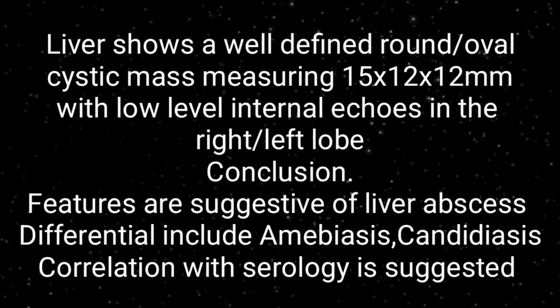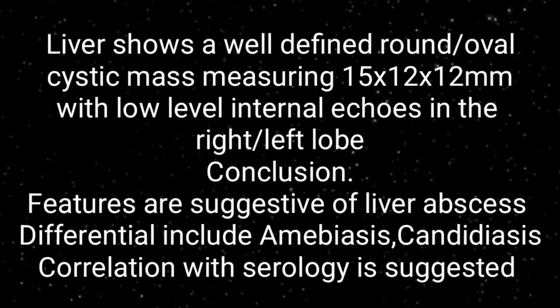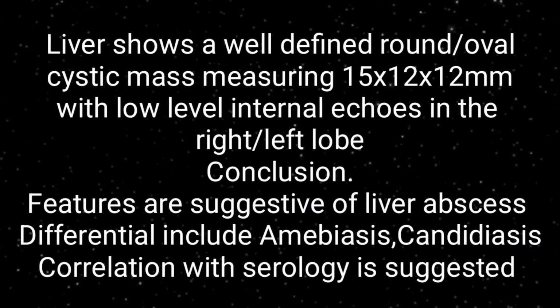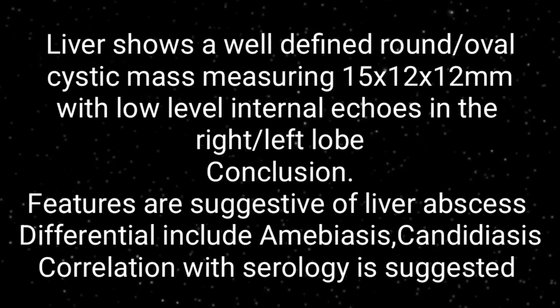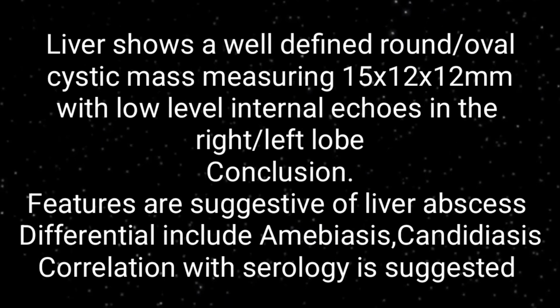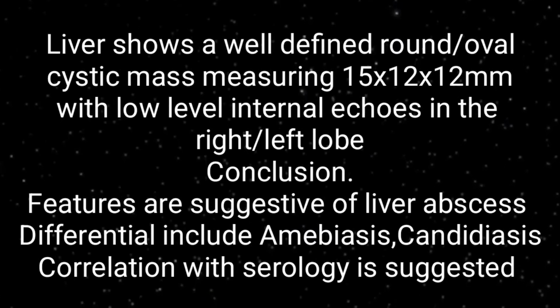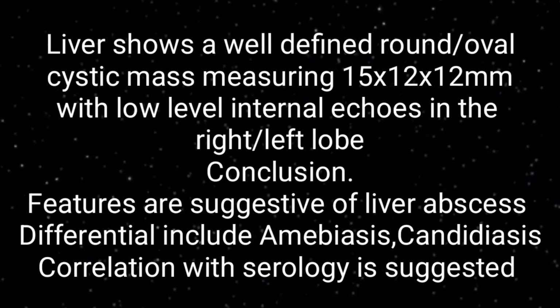Keep in mind that on ultrasound images, bacterial, fungal and parasitic infections look similar with subtle differences, therefore it is important to correlate clinically and serologically. So always mention this in your report, that clinical and lab correlation is suggested for confirmation of the diagnosis.